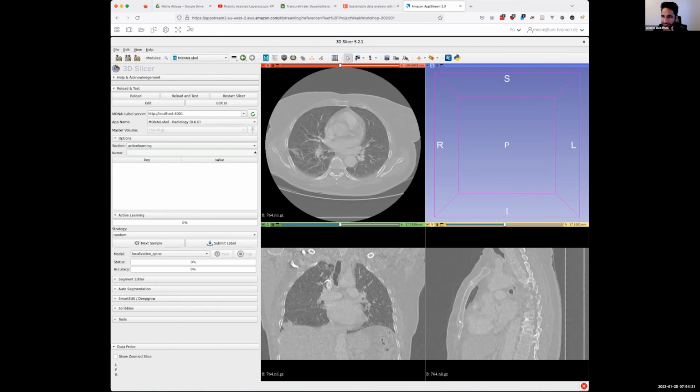There was another question regarding the functionality of next sample, something like going to the list of all the images. That's definitely possible. You can modify that. It is not hard coded. It's also possible to easily just drag and drop new studies, new files into Slicer and then run on those however you like. Let me see if there is another question here.